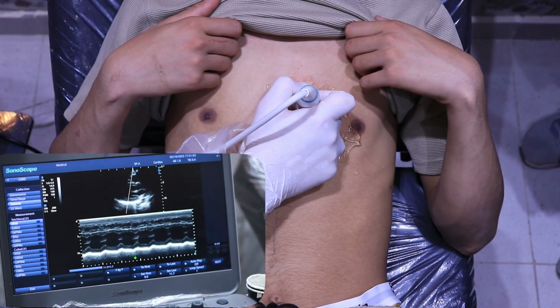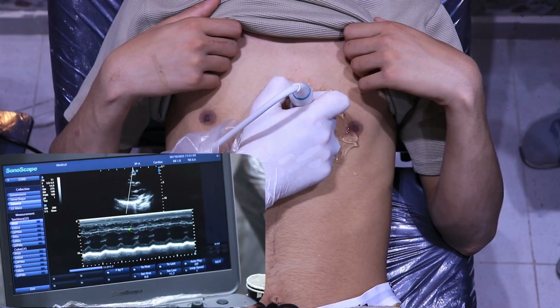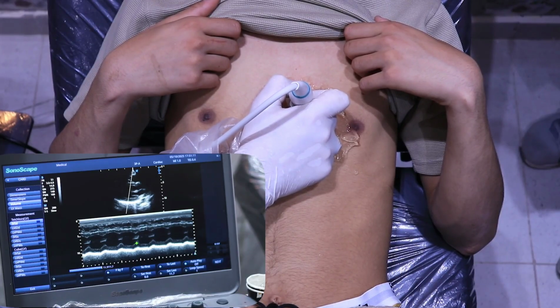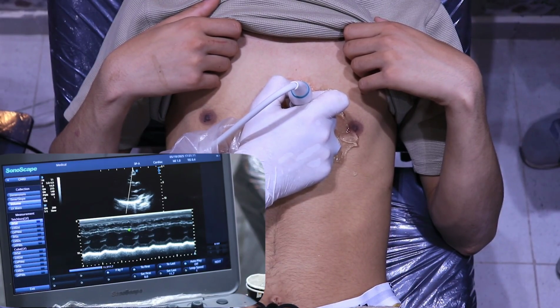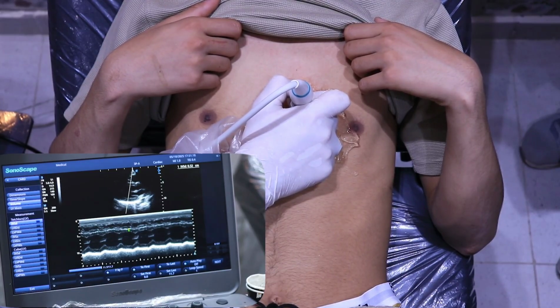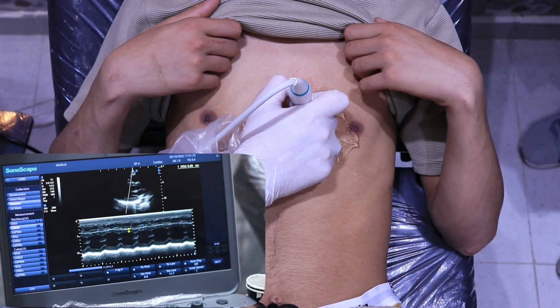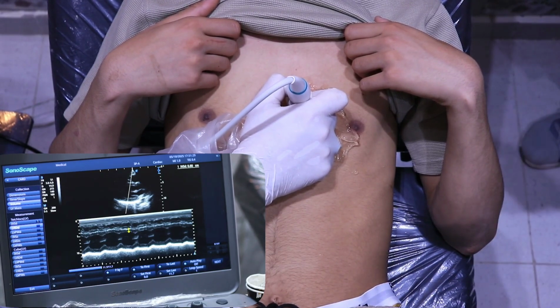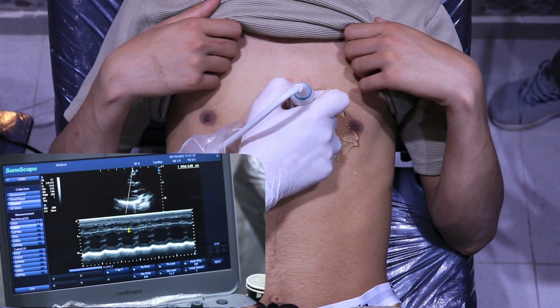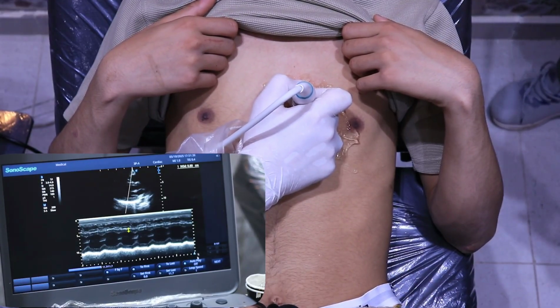This is diastole. Here the ECG helps us know the cardiac cycle, but in general this is diastole and this is systole, right? So we start with diastole. This is the diastole. We'll select and we'll go here and select. So the IVSD is 8 millimeters, okay? Doctor, just a clarification: how do we know why it didn't start here? Oh, okay, very good.